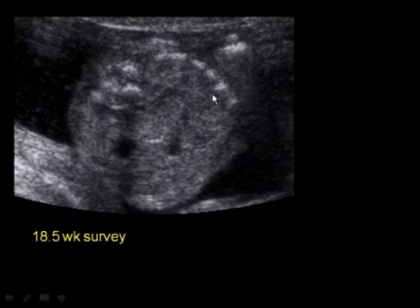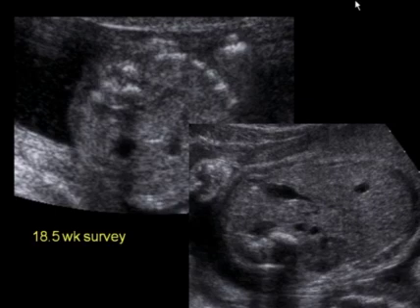Here's a patient who was seen at 18.5 weeks with normal kidneys reported, and this is the image that came out labeled kidneys. Here's the stomach, and we can see a probable kidney on the right, but there's nothing convincing on the left. There's a little hypoechoic structure here, but this is too high to be in the region where a left kidney should be because we have the stomach right there. And indeed, when this patient returned at 30 weeks, again, here's the right kidney, aorta, IVC, stomach bubble, and a little hypoechoic area here, but no definite kidney seen in the left renal fossa.